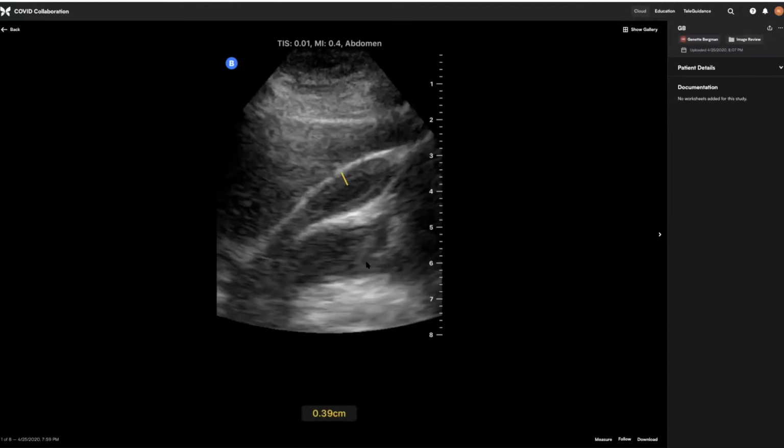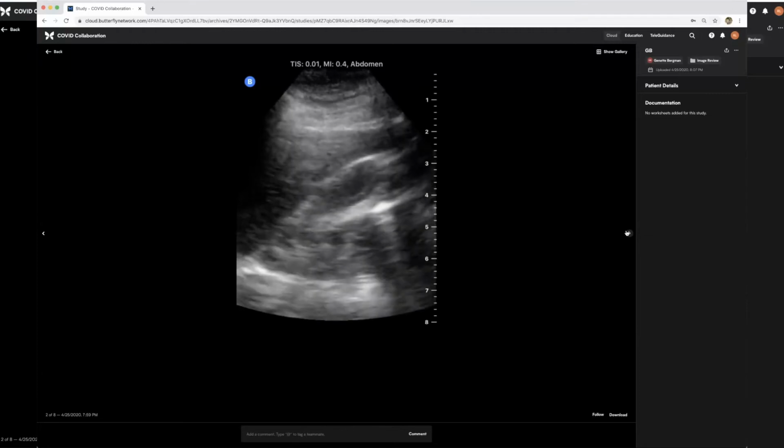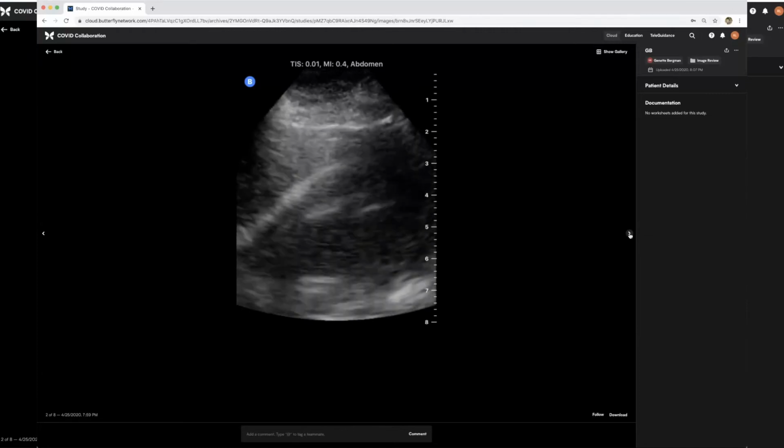And then it looks like this person measured the anterior gallbladder wall, which is a fairly good measurement, and it's where we would typically measure to avoid the posterior acoustic enhancement that's happening there. So I just thought that was kind of pretty, that they could get that definition, because contracted gallbladders can be pretty hard to find sometimes.